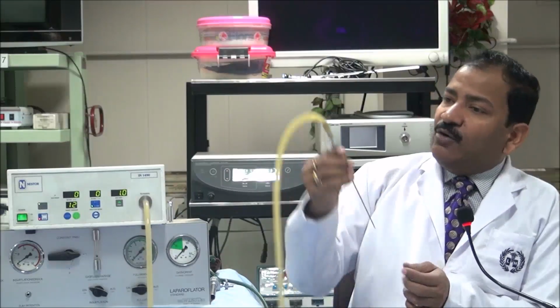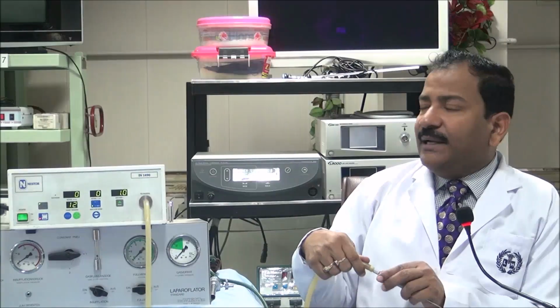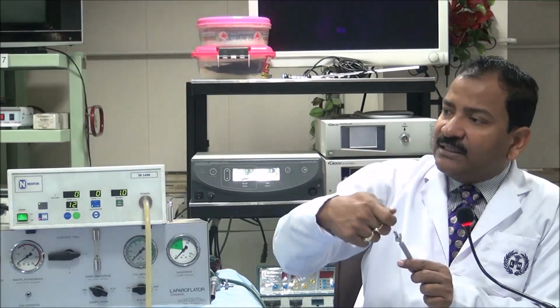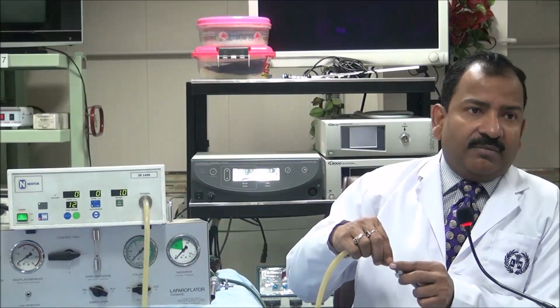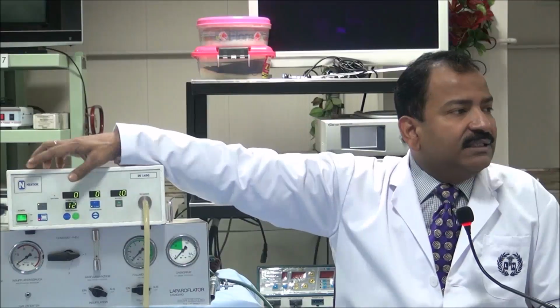So some people go in the attached condition also. But in our opinion, it is not good. What you should do, you go and do hanging drop, suction irrigation. Hanging drop is better. And then you attach it, and then you start the flow. Because the hanging drop test or piston test or plunger test gives you better information than this negative reading.